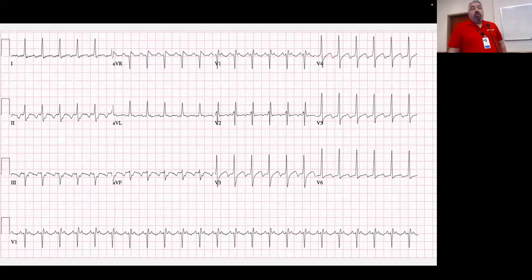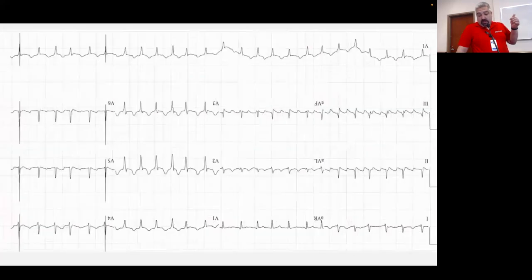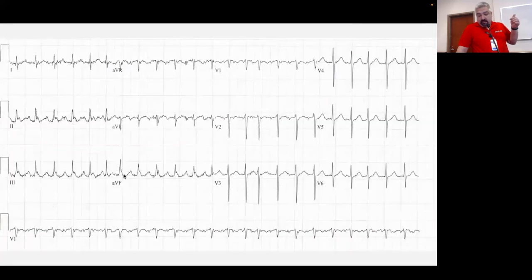If it's conducting 2-to-1, because the atrial component is clockwork regular, what determines whether you have a regular or irregular ventricular response is what the AV node chooses to do. Commonly it will allow through 2-to-1, so it can be narrow and regular. But this one you can see has some irregularity to it. In this part, it's having variable AV block. So this one can do both.